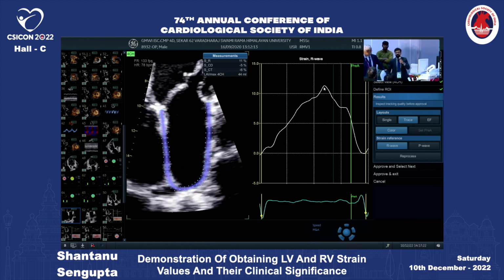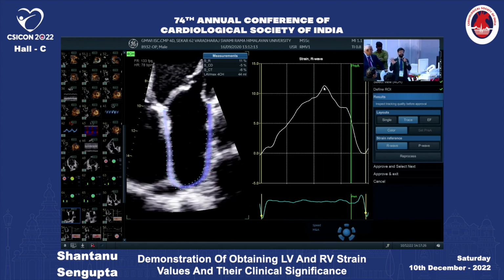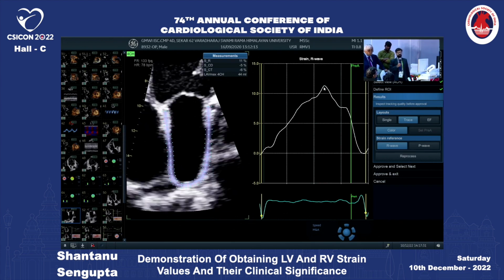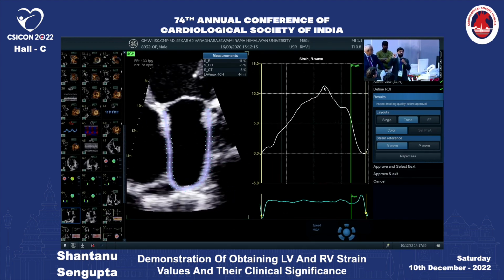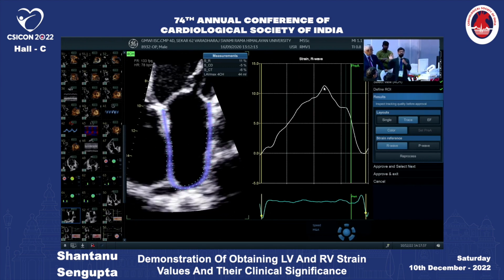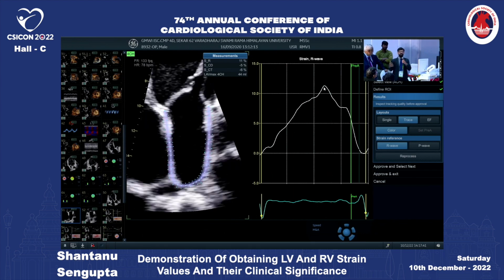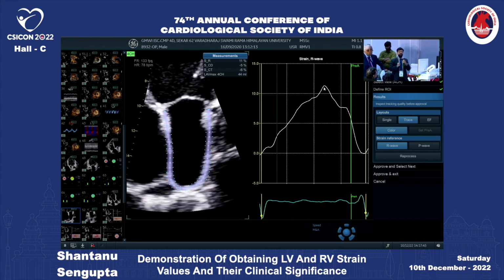I think these two are both independent tools which give you a lot of information. If I can tell you, 27% of HFpEF patients may have normal LV GLS but may have attenuated LA strain. So there is something called primary atrial cardiomyopathy, where only LA strain is declining.